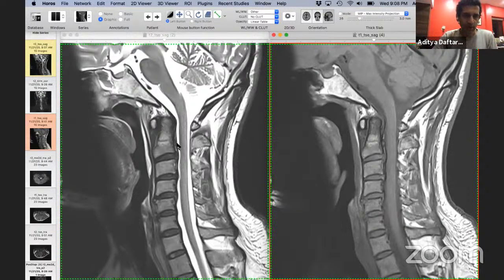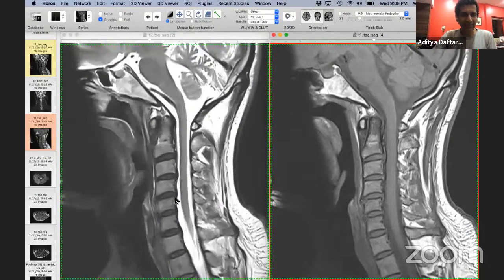We can look at disc contour. We can look posteriorly at the posterior longitudinal ligament. We can look anteriorly at anterior endplate spondylosis. And basically looking at these sagittal and parasagittal images, one gets a sense for how much of the canal is compromised as a result of this disc herniation. Obviously, this is better confirmed on axial images where you slice through each disc level.